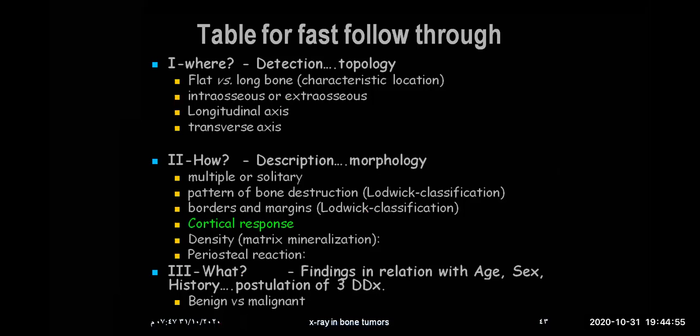Now we'll see the cortical response. We start from the center. We see what the tumor did to the bone and how the bone reacts to the tumor. This is in the center. Then we go a step further to see what the cortical response is. Okay?